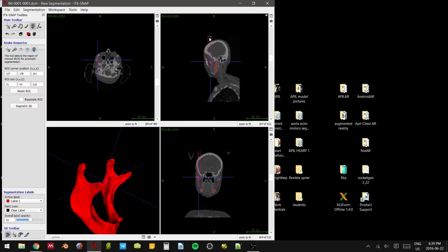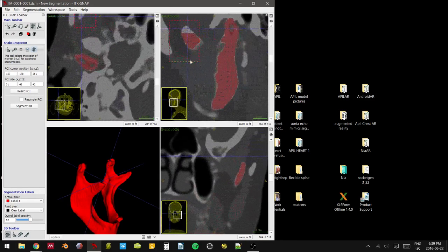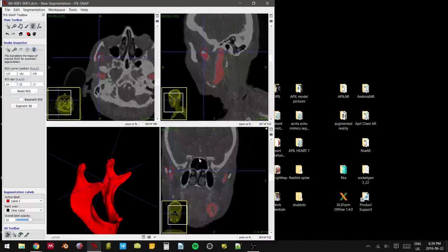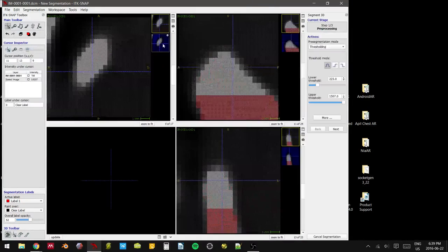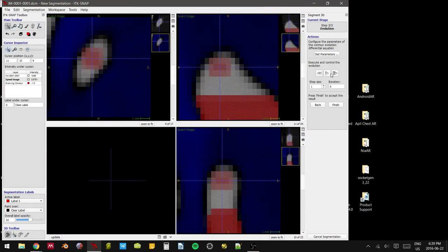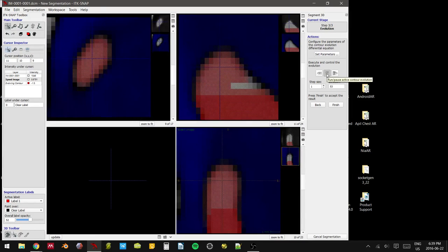Bone is incredibly easy to segment out. It's actually quite nice to do. It's very straightforward and simple, and you don't have to mess around with your thresholds between segmentation attempts. It's just so bright. Finish.